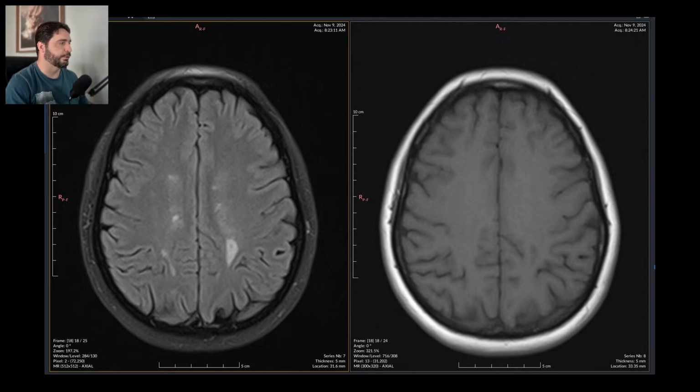No restricted diffusion, no anomalous contrast enhancement, so it's like it's supposed to be for a disease that hasn't gotten worse as much as we can tell comparing both previous and today's exam. So let's just go for a quick and brief description.